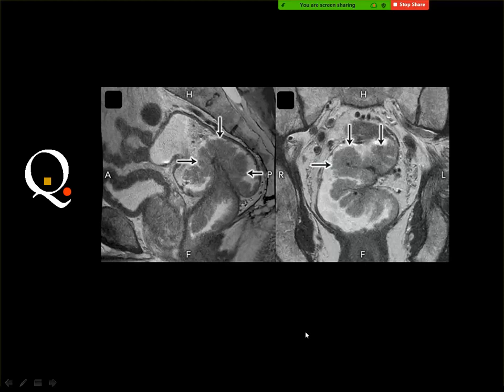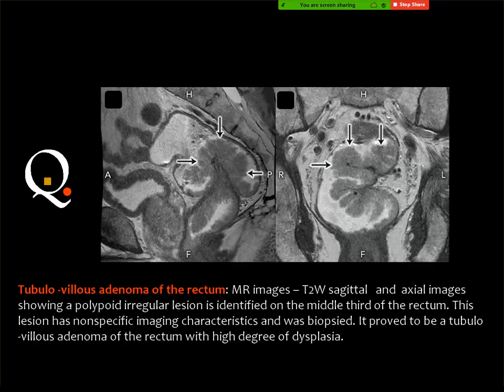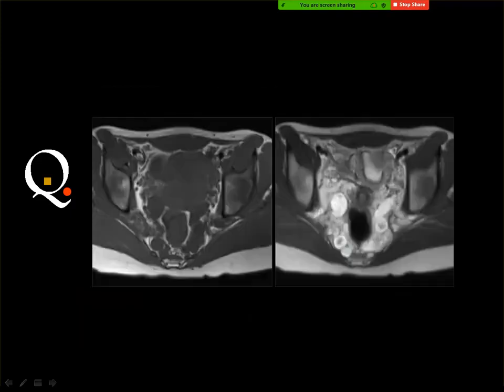Cauliflower. No. You remember the villous adenoma of the rectum, which looks like a carpet, tubulovillous adenoma. You remember it? This is very characteristic appearance, which is frond-like, a big cauliflower lesion with distension of the rectum. This is a benign lesion with a very characteristic appearance. Okay.